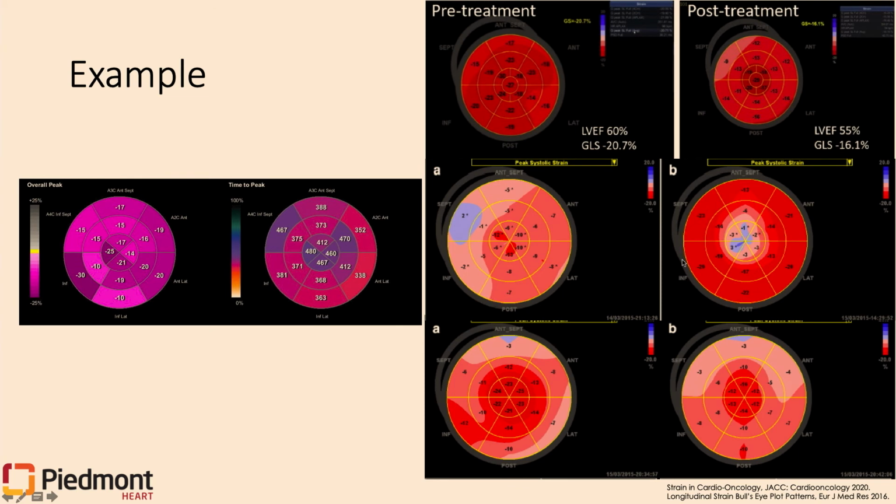And in this example, the patient has normal strain in the base segments, but quite abnormal focused in the apical segment. This is apical hypertrophic cardiomyopathy. Here, there is apical sparing, where the apex is normal, but strain is abnormal everywhere else. And this is a patient with biopsy-proven cardiac amyloidosis. This kind of target sign or apical sparing sign should alert you to amyloidosis. And this patient a year later still maintains that strain pattern on their bullseye plot.